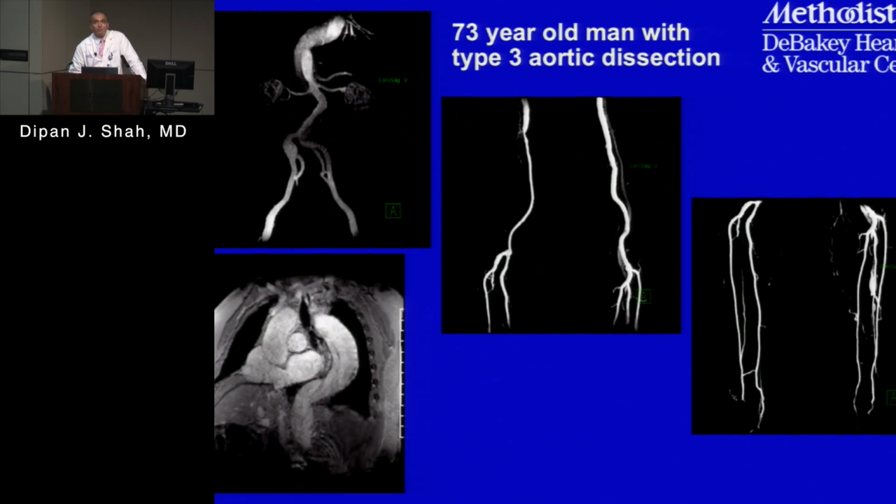Okay, it's definitely not equal size, you mean? Yeah, so this is the right and this is the left. So basically what you look at here is the superficial femoral arteries and the trifurcation, and these are the infrapopliteal vessels here. On the right side here, right? So you've got a little narrowing here.